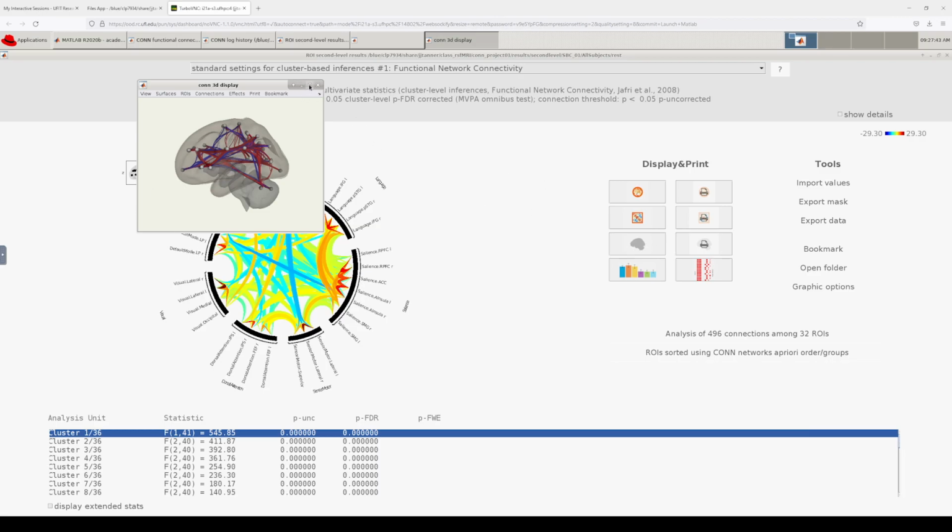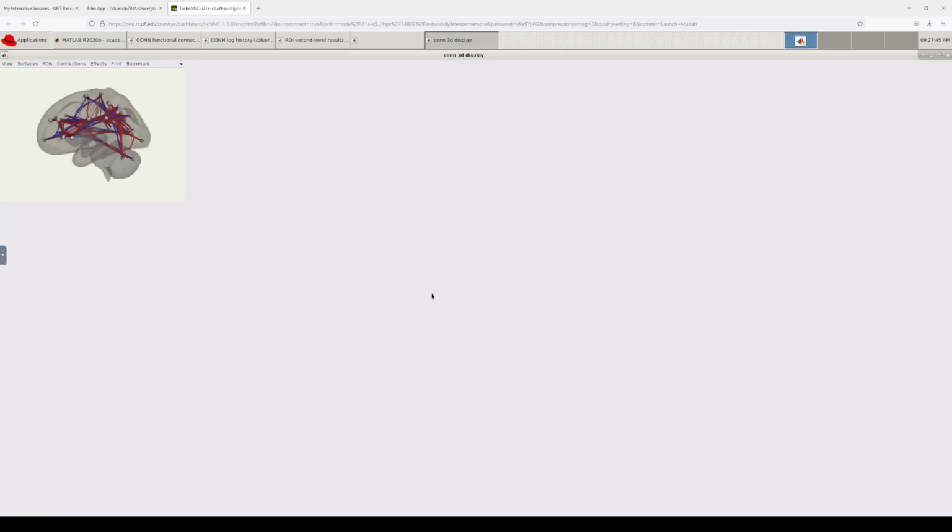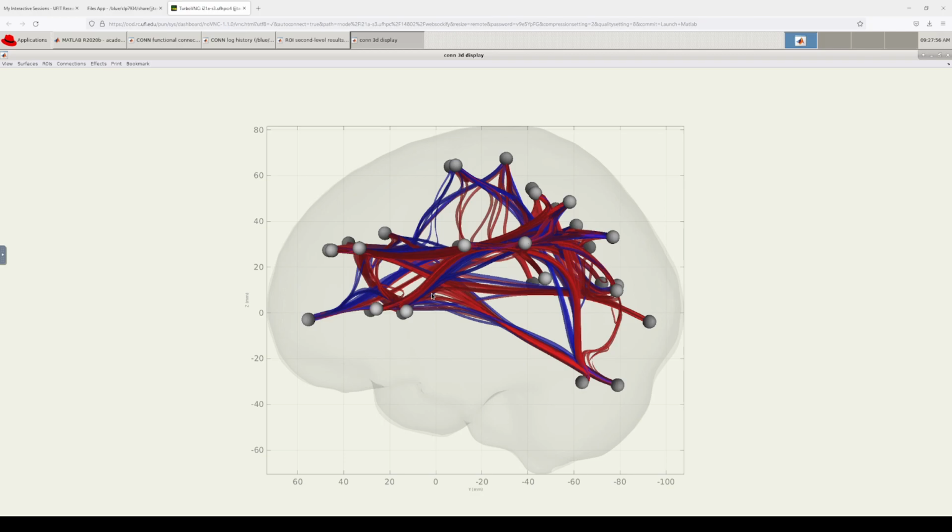But if you click on that 3D brain, I'll make that a little larger, then we can get a sense of where these are. I don't know if I should have made it quite that large. It tends to be a little bit slower trying to do this visual 3D view on here. But you can click and drag and rotate this, and that'll be slow because it's a large image. And again, trying to do HyperGator, or the way I'm displaying HyperGator, not strong graphics capabilities.